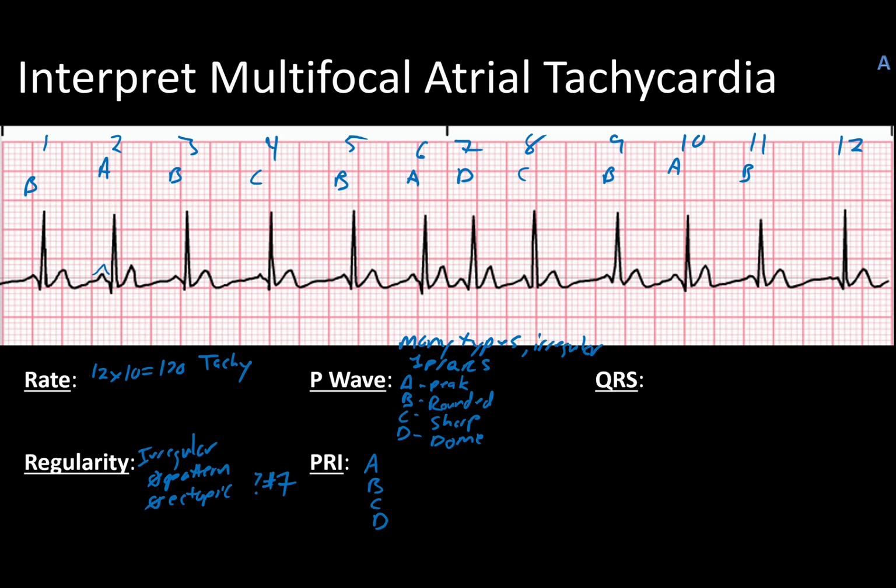So let's see what we get. Let's measure out the A's. This will be pretty convenient because we can measure starting here. I'm going to say this one actually starts when the wave shifts shape, so I'm going to go out here and say that's 1, 2, 3. So I've got about a 3 for that one.